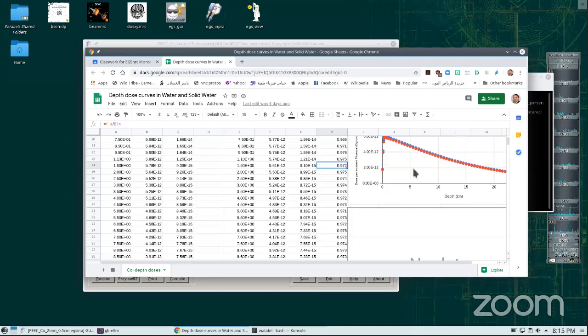But with Monte Carlo, instead of water, we can actually put bone material, where we have calcium and so on. For lung, we can replace it with the composition of actual lung, not density-weighted water. Then we can compare how different the dose in the treatment planning system, reporting doses to water even in this heterogeneous medium, is compared to the actual doses to that medium.